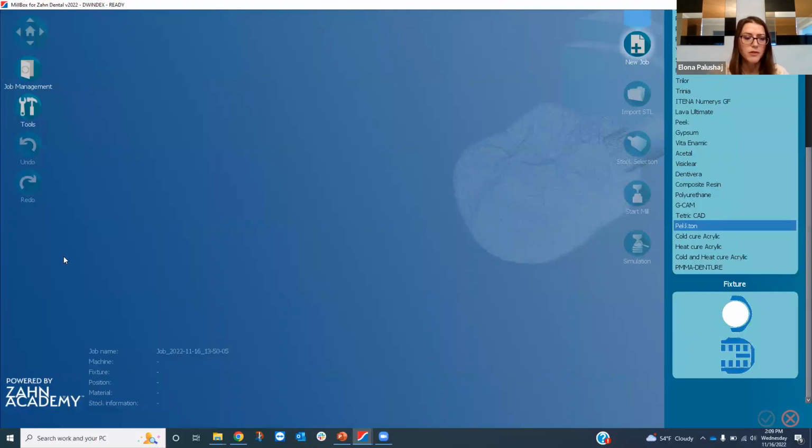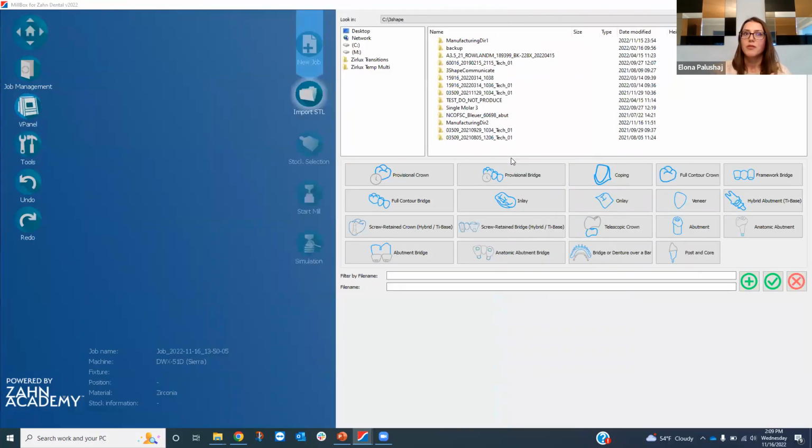So you have the manufacturing directory where you dump all of the files as generated from your CAD software, or you have one that's a little bit more organized, which could be separated by material, it could be separated by case, anything of that sort.